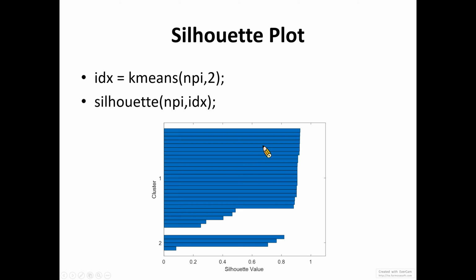So that might indicate that we have one cluster here, two clusters here, and maybe three clusters. That is one possible interpretation. But again, I want to emphasize that the number of clusters still depends on your hypothesis. That value is not the sole criterion you should look at.